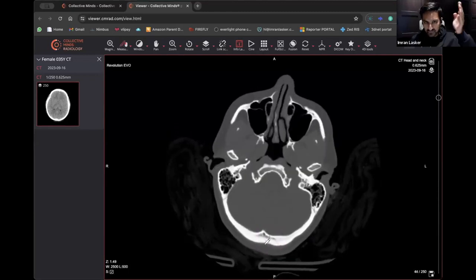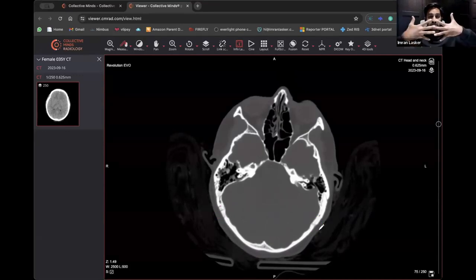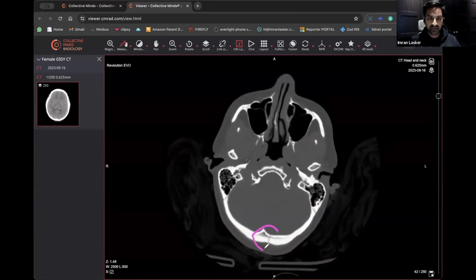So you can have a suture, right? You can have sutures, and I'll show you what a suture looks like. That's the suture over there, and that's a suture over there. And the way you can know it's a suture is because they're like jigsaw puzzles, and you've always grown up with them. They know each other, they're close, and they're going to be like that. But when you get a fracture, that's like an introduction of something new, and that is a very abnormal sort of looking line. And when you see that, you can see there is a fracture lying there.